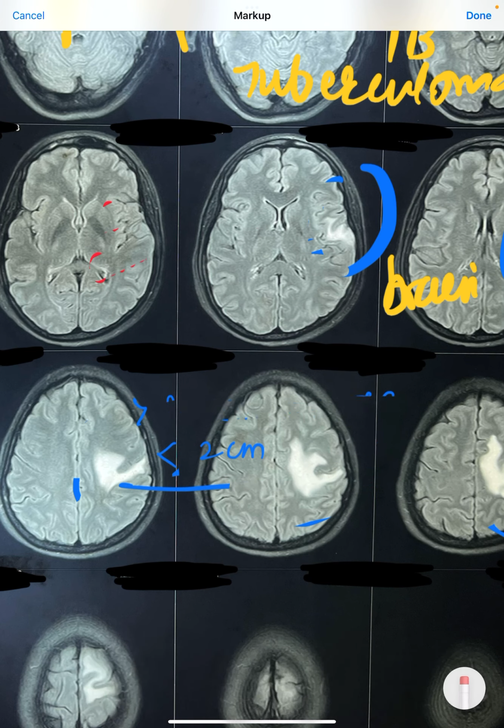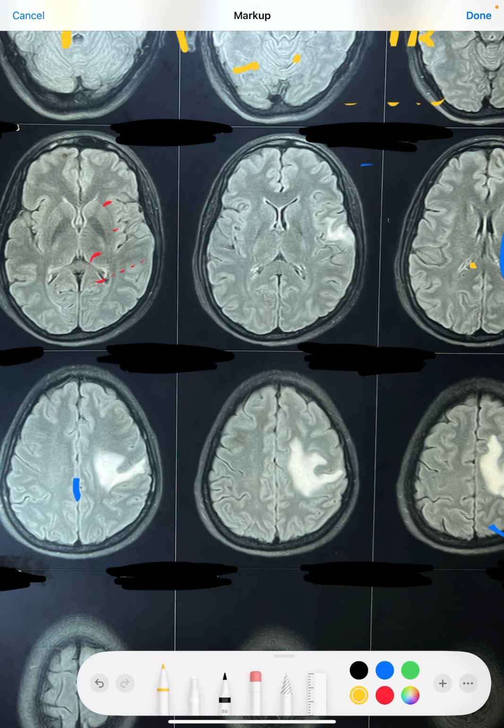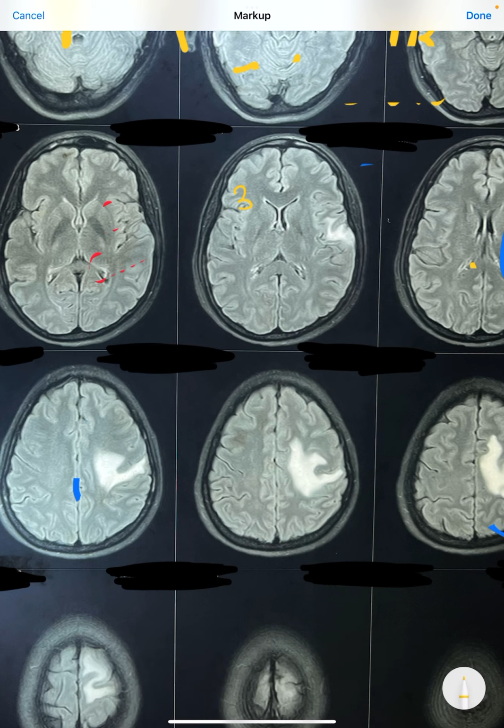Patients may have hundreds of small granulomas, whereas in tuberculoma, or tuberculous lesions, it is very commonly a few discrete nodules or lesions. You may get around 3 to 4 to 5 to 6 tuberculoma lesions, but in NCC, it can be in hundreds. So it is very important to know what favors what. If it is less than 2 centimeter, it favors NCC.